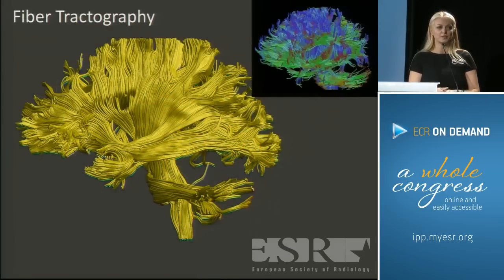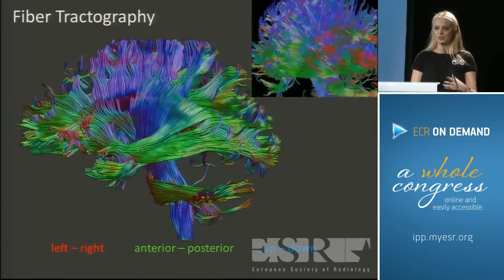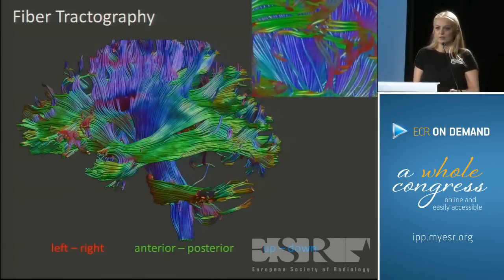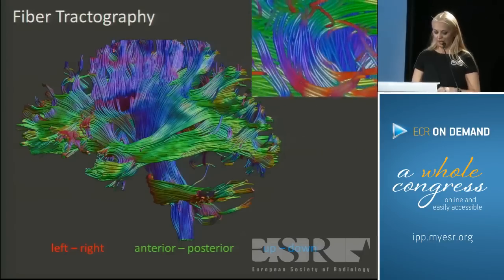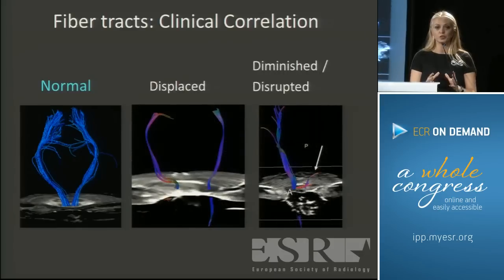And finally, besides diffusion, you all know this. You will see many lectures in neuroradiology. Neuroradiologists love these spaghetti pictures of the fiber tracts. And if you have them in different colors, you know, of course, where they're going up and down. And then you can ask yourself, do I need this for brain tumors, to know where the fibers are going? Well, it would be very beneficial to look at what the tumor is actually doing to the fibers.